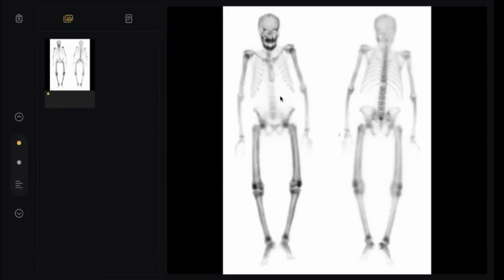Then, in all bone scans, my colleague: sir, why was there symmetrical bilateral uptake in both tibia and femora? Does it happen in renal osteodystrophy? Listen to me for 1 minute and I will answer everything. Listen, okay? What happened here, my colleague?